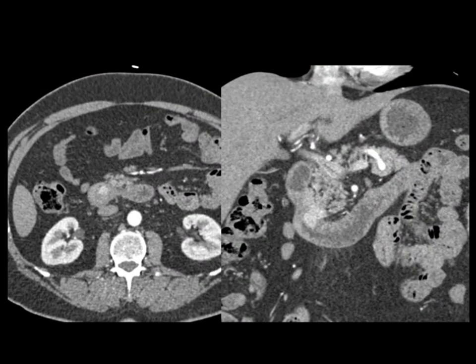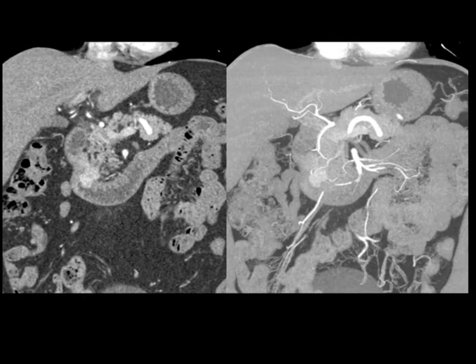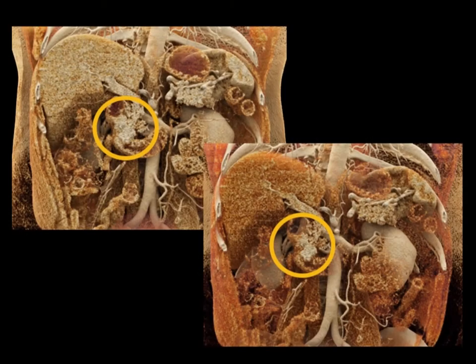And you can see this here as well on the coronal view. Again, the coronal more puts it in the duodenum, but if you told me this was a gastrinoma and it was off the duodenum pushing in, I would not argue with you. Here it is again with the volume rendering and the MIP. The MIP showing very nicely the patient's feeding vessels. Here's a good example showing it to you with the 3D mapping, with cinematic rendering, the textural changes, the reaction around the duodenum, the retraction, all very nicely seen in this example.